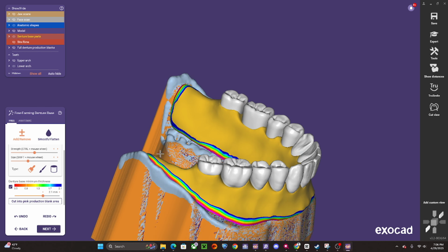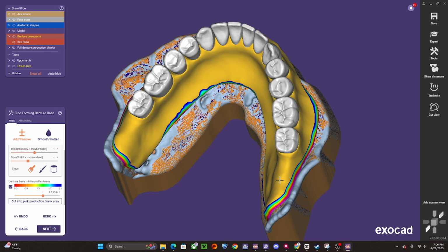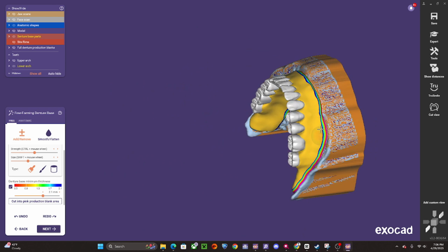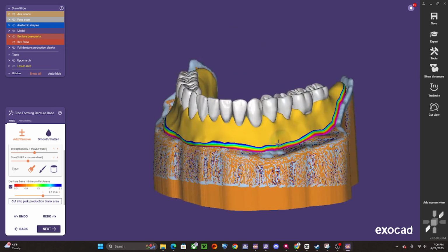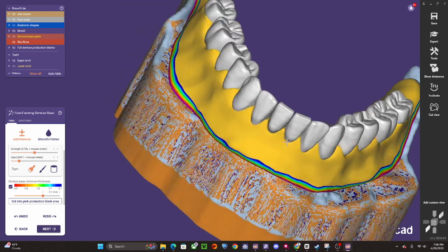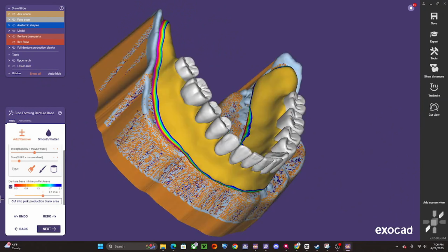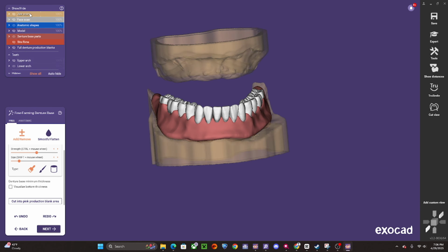We want to thicken up this part of the denture base as well. It's a little thin right there upon generation. And if you need to extend the border, do that here, right? That's the best part in time to do it, is when you're going through these thoughts in your design, right? Is this an area I want to cover? It's great to do that in this aspect of the design.